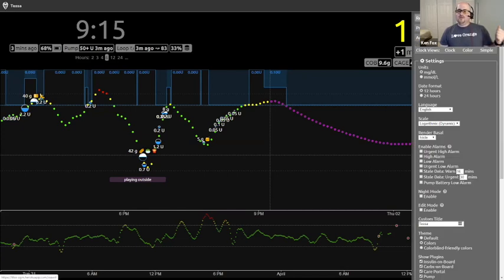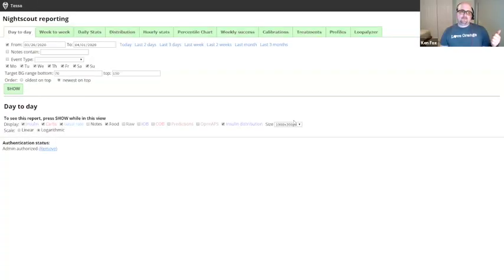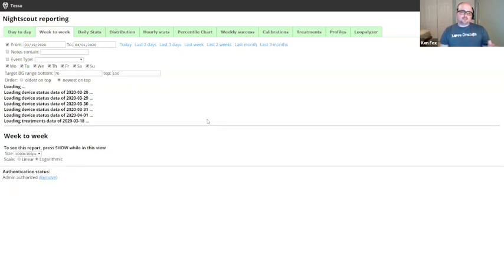Okay, reports. So menu, reports. Okay, so we've gone over the day-to-day, which you need to check the IOB and the COB for, because that's amazing information. That's great. Predictions isn't super helpful, but whatever. So all these are great. We've talked about how to use this report a little bit. Week to week kind of gives you a snapshot of just like big stats.